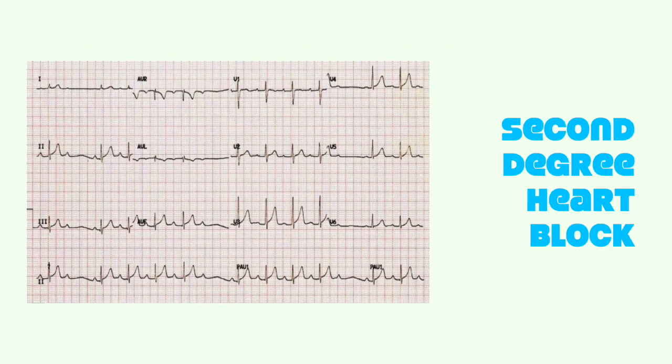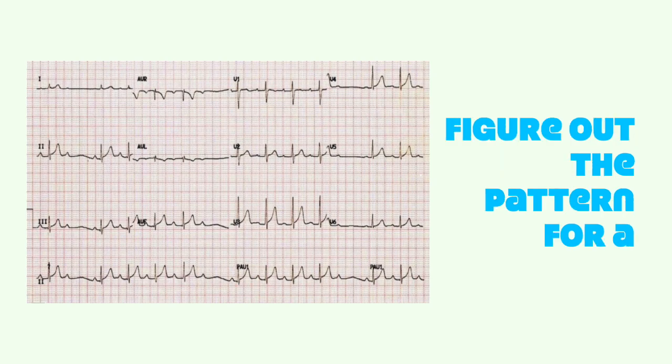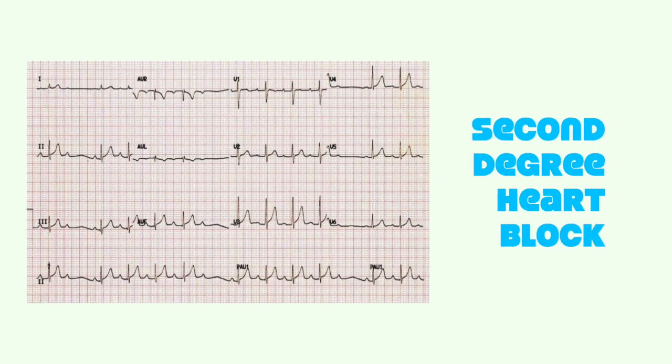This ECG is an example of a second-degree heart block. We'll pause the video again for you to figure out the pattern for a second-degree heart block.